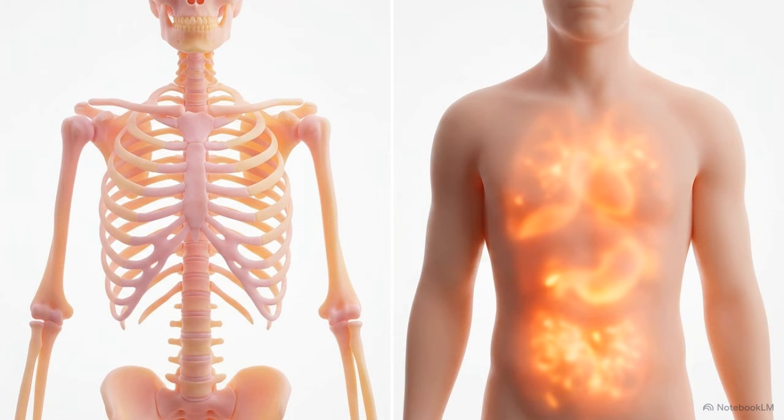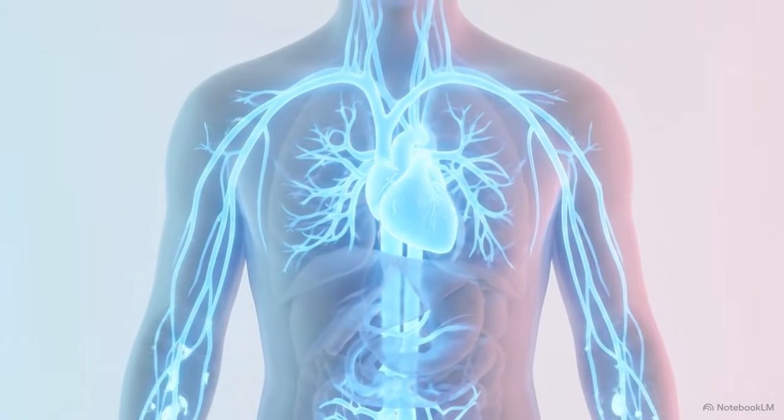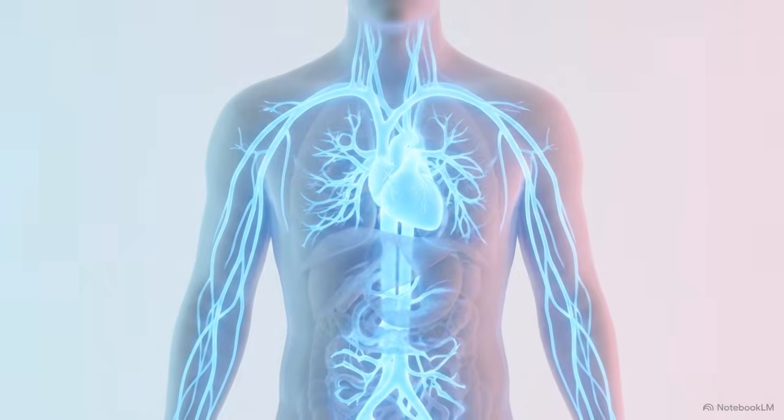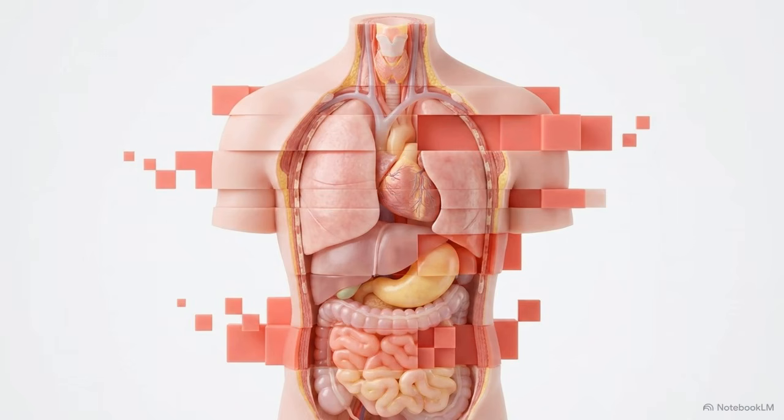Unlike a CT or an MRI, which map static physical anatomy, nuclear medicine maps physiological function. As this glowing radiotracer branches through the vascular network, we are looking at living biological processes in real time. But translating that injected radiotracer into a precise, pixelated image requires the signal to survive a chaotic journey. At almost every stage, it is susceptible to physical and computational corruption.